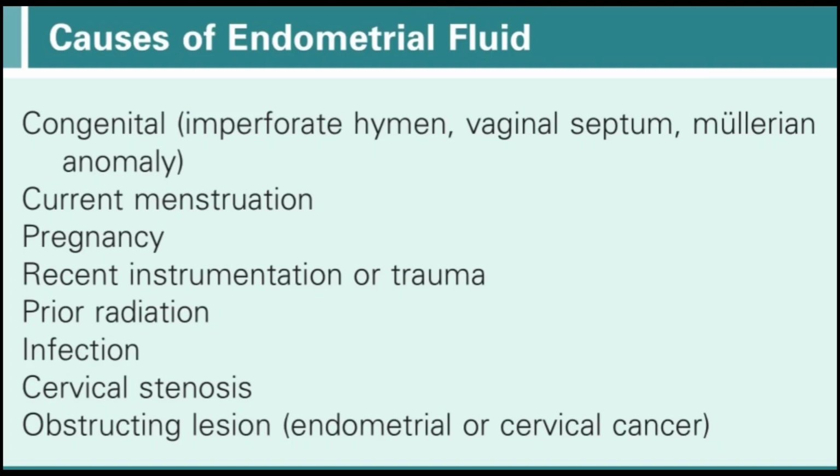This list shows causes of endometrial fluid. Many a time when you are scanning the patient, either transabdominal or transvaginal, you may come across small to minimal or moderate fluid within the endometrial cavity. There are certain reasons. These are the differentials which are responsible for the endometrial fluid.